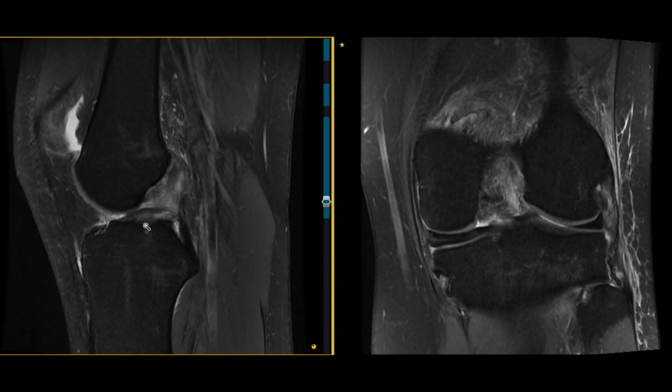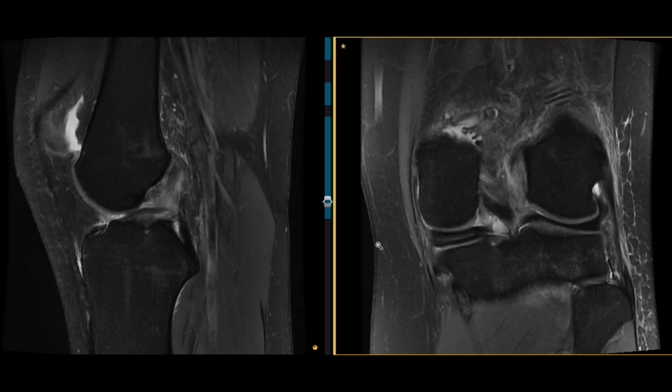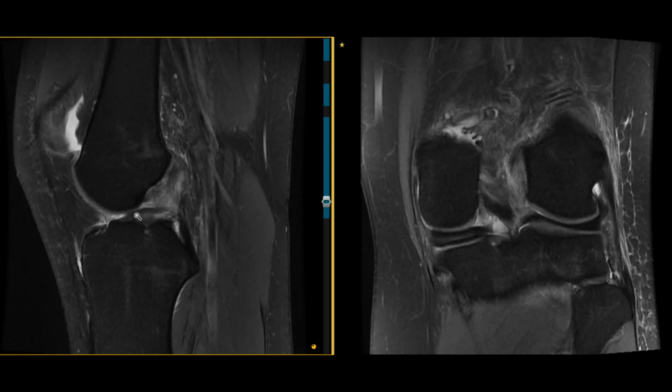This is an acute MRI post-ACL rupture demonstrating significant detensioning of the ACL. Here on the sagittal sequences, you can see the tibial-sided fibres of the ACL demonstrating a fairly horizontal configuration, a fair way away from Blumensaat's line, consistent with a significantly detensioned ACL. The ACL in this case also happens to have a significant gap between the two ends of the ACL, but the purpose of this video is to show you the classic appearance of detensioned tissue.